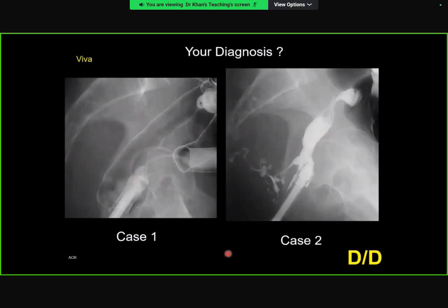So it's a single spot image, lateral view of the barium enema with the Foley's in place in situ. There is a kind of featureless appearance of rectum that I think that's what I can see. I cannot see any polyp or any mass or any constriction on this single spot image.